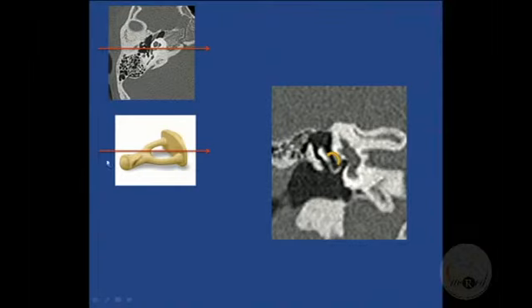And then, if you're in the right true coronal plane to the stapes, the slice goes through this portion of the stapes and then you hit the obturator foramen. So it looks as though you don't have anything going to the oval window, because that's the obturator foramen. If you see a structure going all the way through to the oval window, then it is abnormal, right? That indicates a stapes which does not have an obturator foramen.